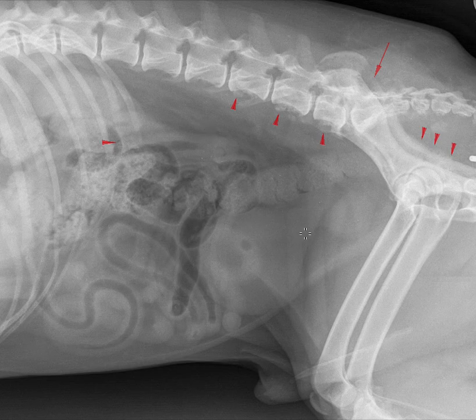Once I'm satisfied that there's an aggressive lesion, and in this case, I'm very satisfied that there's an aggressive lesion because of the irregular periosteal reaction and the bone lysis, I then categorize it. This one is clearly polyostotic, meaning it involves more than one bone. If I summarize the osseous findings taken together with the prostatic enlargement, this is highly consistent with a primary prostatic neoplasm and regional osseous metastasis. Be sure to review the full report for this case for some other minor findings and a brief discussion about these lesions.